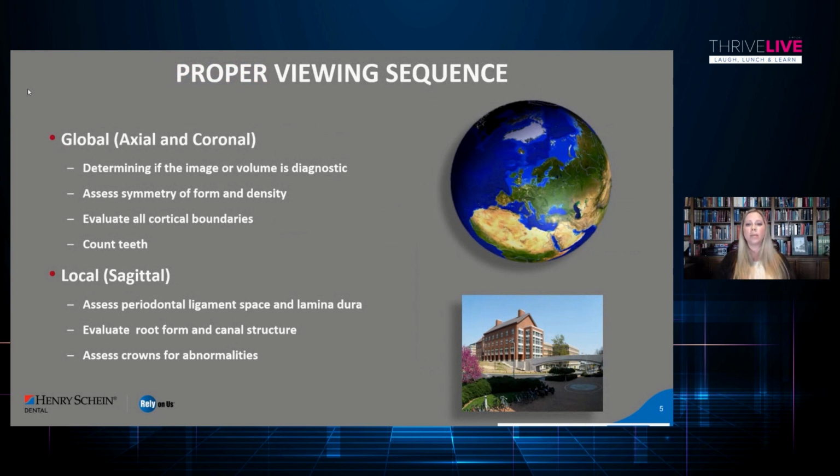So when we are coming up with a sequence, the very first thing that I like to do is look overall at the cone beam CT scan. I like to have a global approach.